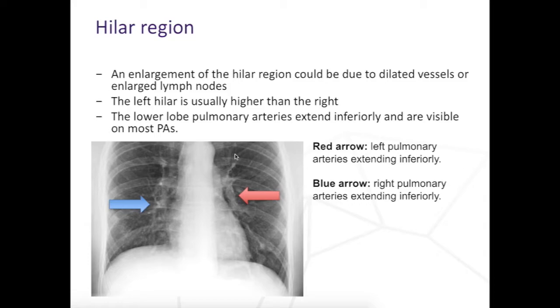If the superior region is more prominent or becoming quite enlarged in comparison to the patient's old films, or it just generally looks a lot larger than it should be, that's a good sign of pulmonary edema, where pulmonary fluid has accumulated inside the pulmonary veins, and because of backflow, it has flowed up into the blood vessels, and it goes everywhere. So an indication of early pulmonary edema is upper hilar region enlargement.